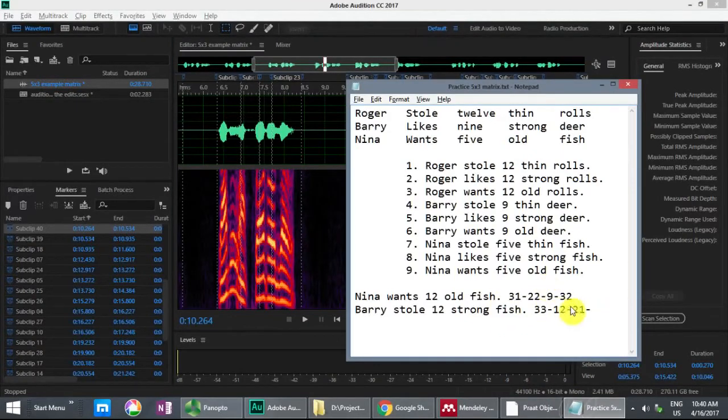All right, so, and that was... so let's audition. Nina wants 12 old fish.